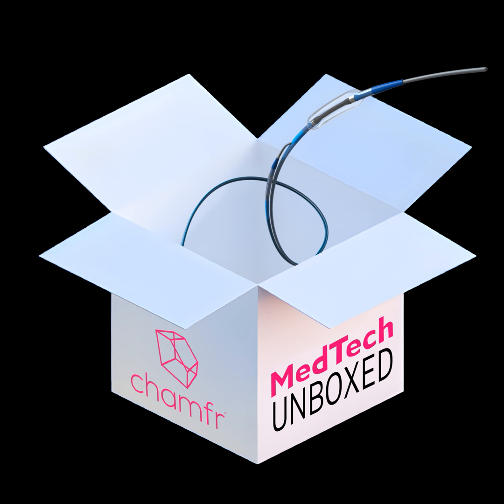So for every braid layer, or every layer defined as a braid, you can choose braid or coil. Okay. And for coil, you can pick the pitch, the number of filers, wire material, round or flat wire, and diameter. For braid, there's a few more choices. You can choose the pattern as well. Yeah, you can do diamond, pretty much everything common. Slick. Gotcha. It tells you exactly what you wanted.